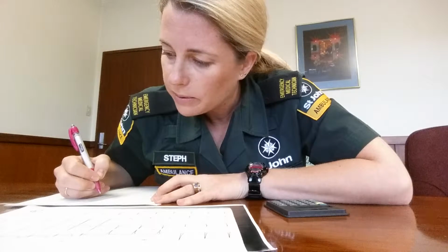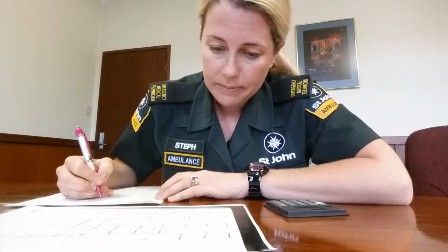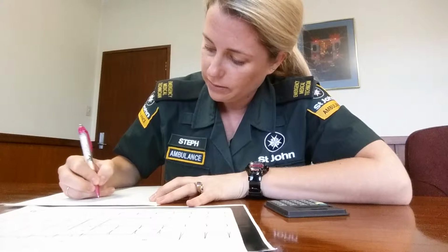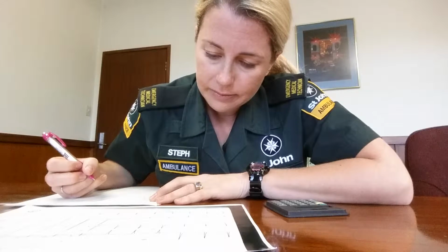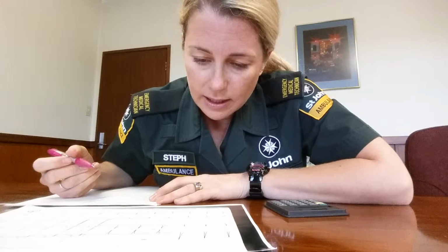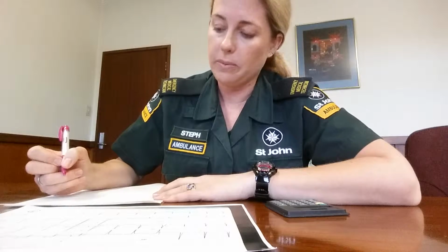Looking for Q waves in the precordials. No, pathological Q waves need to be greater than 0.03 seconds wide or a third of the height of the R wave. QT interval, since it's normal, I can look halfway between the two R's for the T wave, and it's not more than halfway, so I do not have a prolonged QT interval. QRS, it is prolonged, which fits with Wolff-Parkinson-White. It looks like 0.16 seconds. Normal QRS should be less than 0.12 seconds, a normal 0.06 to 0.11 seconds wide.